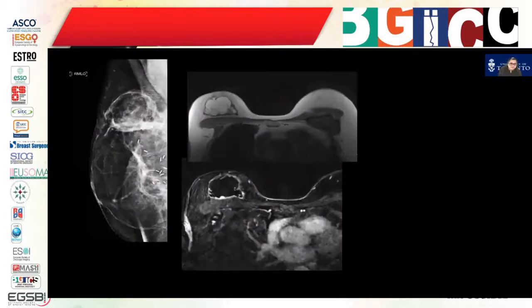Other complications such as fat necrosis are very common, very classic on mammography, very classic on MRI. And here's a big area of fat necrosis. You can see the fat, and they can enhance. Fat necrosis can look like cancer on any imaging modality. It can look suspicious on mammo, on ultrasound, on MRI, elastography, you name it. They can really mimic breast cancer. But when it looks like this, it's very classic.